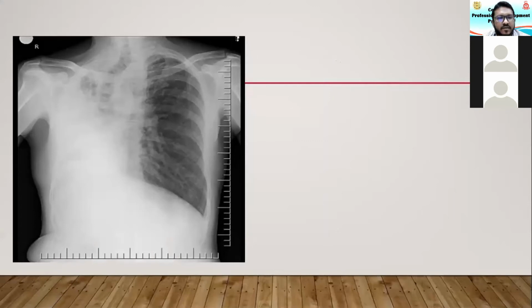Okay, these are what you call the whiteout of a single lung. So here, if you go to the airway, you can see that it's clearly rotated and it's clearly shifting towards the affected side. That means there's a significant volume loss without any mass effect on the other side. So it's a fairly big opacity with volume loss and mediastinum shifting towards that. This is called lung collapse because there is volume loss, opacity, only a minimal amount of residual air, with the mediastinal shifting towards the affected side, which means there is volume loss in the affected side.